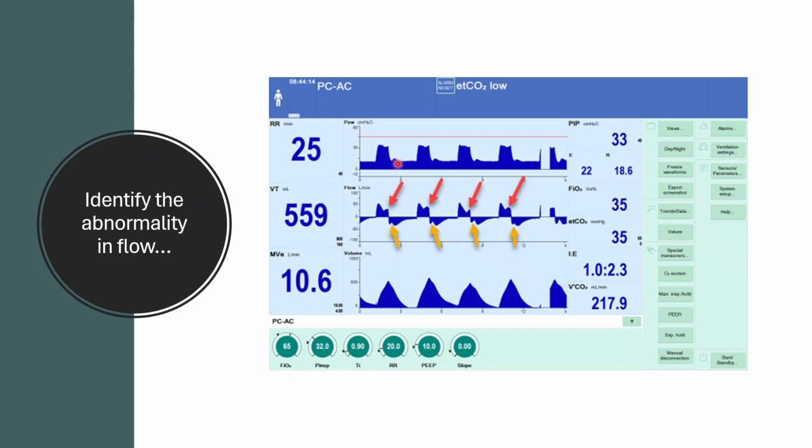However, deflections are seen in both inspiration and expiration. Flow should be decelerating, but during the late phase of inspiration itself, there is patient's effort, as you can correlate with the pressure scalar above. So there is a patient effort here, and because of that, there is a dip in the pressure scalar, right? So there is a triggering happening, which is basically a reverse triggering, which is happening in the late phase of inspiration and early phase of expiration.